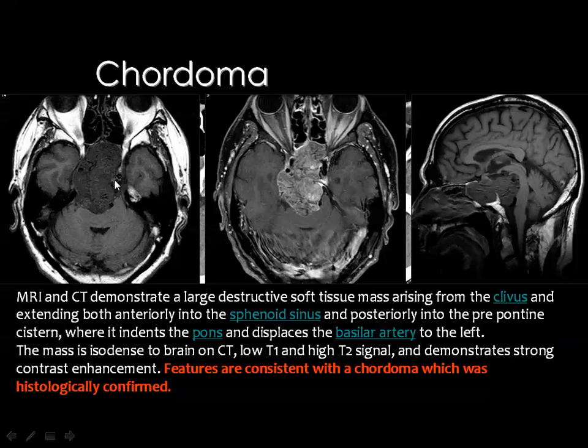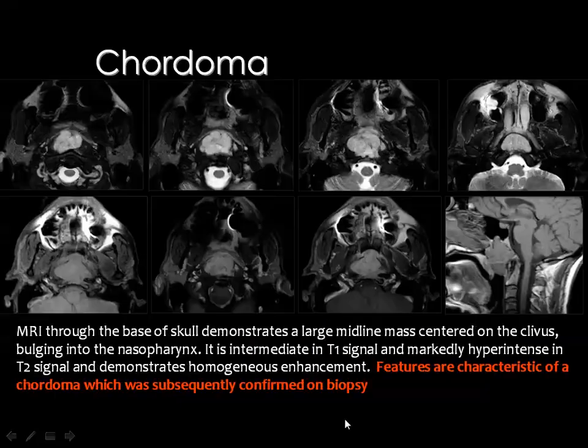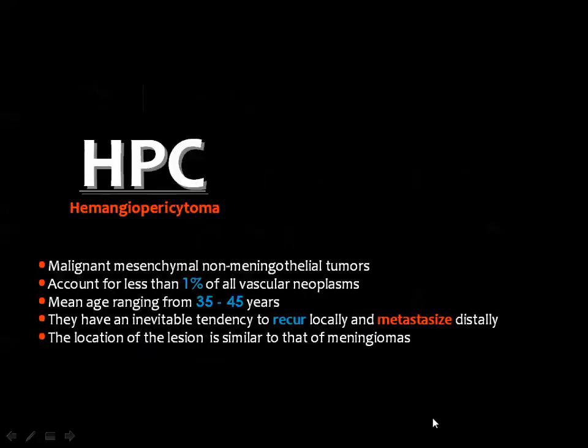This is T1, you see the tumor, and post-contrast T1 weighted image, you see the enhancement. And this is the appearance of the lesion destroying the region of the sphenoid sinus with extension into the prepontine cistern. In the axial T2 weighted images, you see that the tumor is bright. It's not that bright, similar to the CSF, but is somewhat bright, as you can see in all these images. And this is the rest of the exam showing some pattern of contrast enhancement.